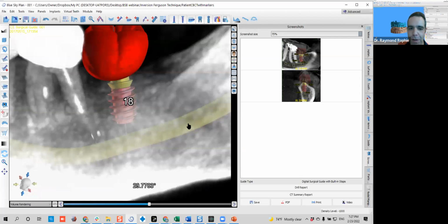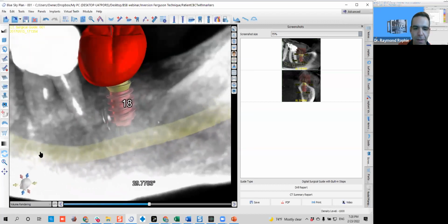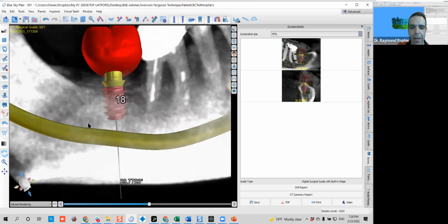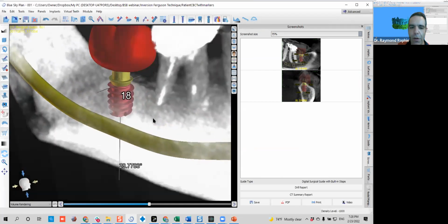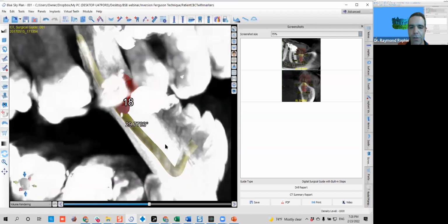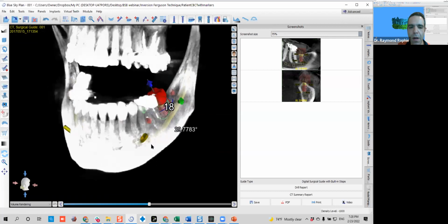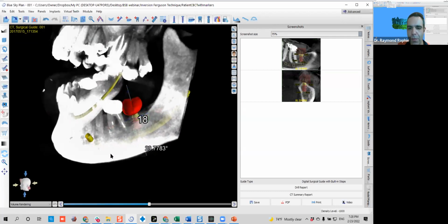It's more efficient, believe it or not. It's away from the two-dimensional world. I am more now in the 3D. So here you can see basically all your positioning, and that way will give you a better perspective of what you are going to see clinically with your patient. Okay, good. So if you finished here with your rendering, why not?